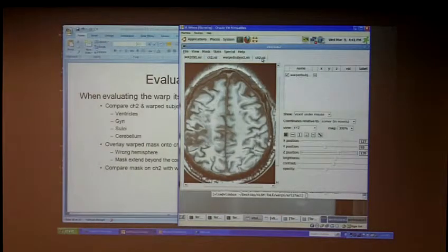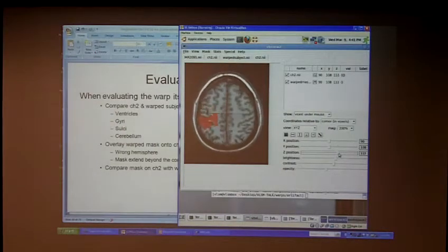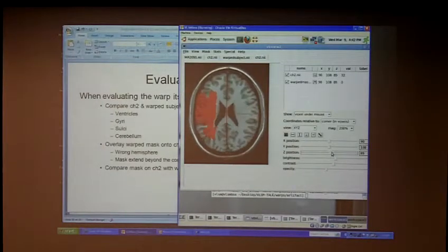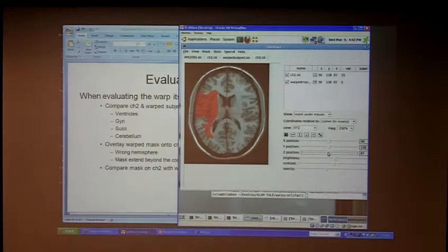And so, the last step is, you actually apply the warp to the lesion mask itself. So this basically is our normalized mask to fit on the template. It takes those same parameters that were used in warping the brain and applies it to the mask, the lesion tracing that we drew. So we can now overlay this on top of the template. It's now in MNI space.